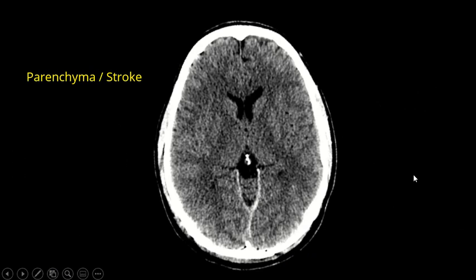So why is this intermediate window important? Or how do we go through a scan reviewing all those 3 windows? So in this example, which was a trauma, patient has subdural collections, we start by evaluating the parenchymal or stroke window. We see the gray matter, the white matter, see that there is nothing in the brain parenchyma at this level. I suspect that there is blood in the extraaxial spaces. However, with this particular window, you can see that the bone creates this margin of ill definition around it, so I can't see the extraaxial spaces very well.